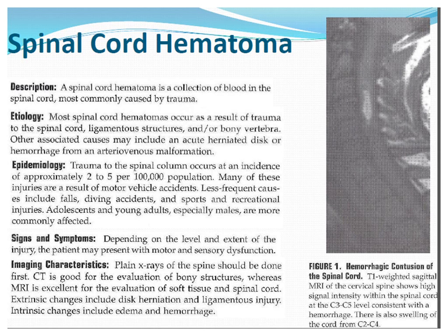You can have obviously fractures, retropulsion like we saw in that last case, an acute herniated disc, that kind of thing. A lot of the time it's going to be due to motor vehicle accidents, as with most trauma. It can also happen from diving accidents and those kinds of things. Once again, with any traumatic injury, younger people are more likely to be affected, and especially males.